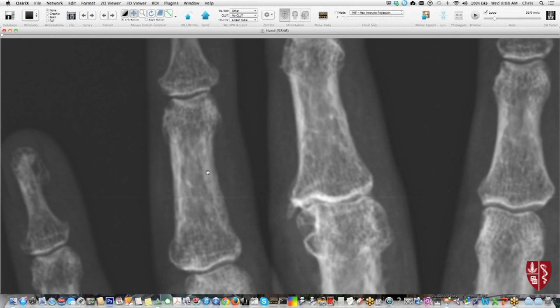So all of a sudden, this subtle finding takes this patient from having, yeah, they have OA, but they probably also have some sort of an inflammatory arthropathy component. And if we see that, then that triggers the clinicians to think, oh boy, maybe I better check a rheumatoid factor, SED rate, blood count, whatever all the stuff is that they do to work it up more.